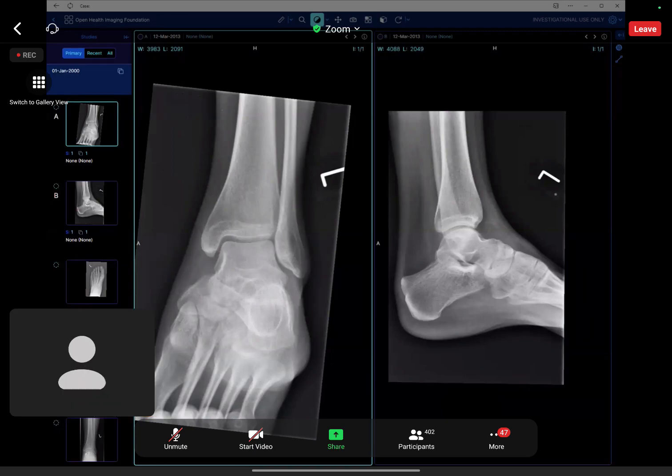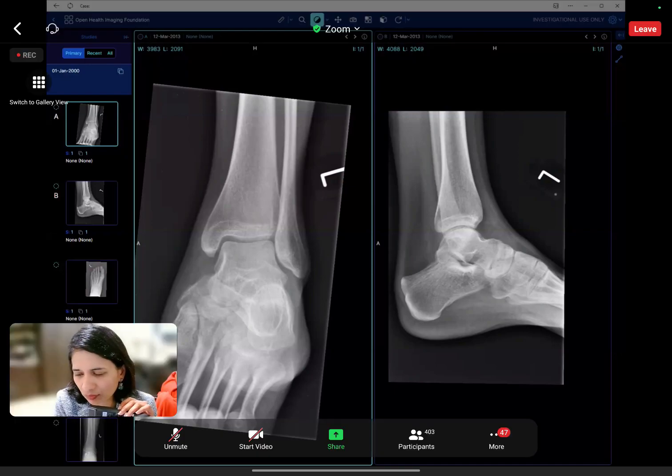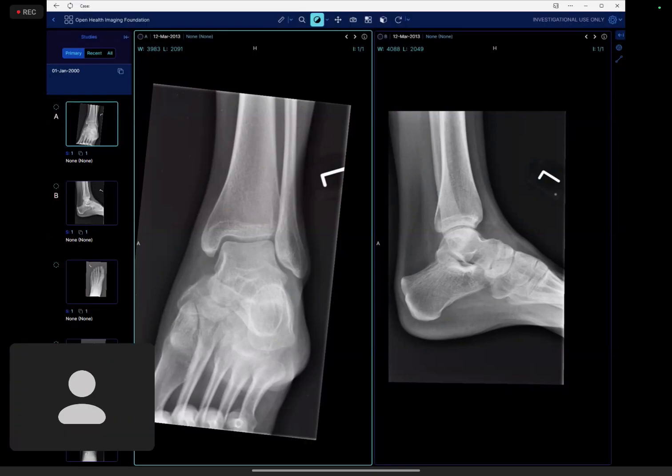Okay, so I'm presented with the radiograph of the ankle and hindfoot. Just having a look, given the history that this patient has jumped from a height, I would like to see if there's any fractures of the calcaneum, which I cannot see any apparent fracture. Trying to see if there's any other, the talus appears normal with normal mortise, which appears well preserved. Looking at the malleolus and see whether there's any soft tissue thickening. I do not appreciate any abnormality in this region.